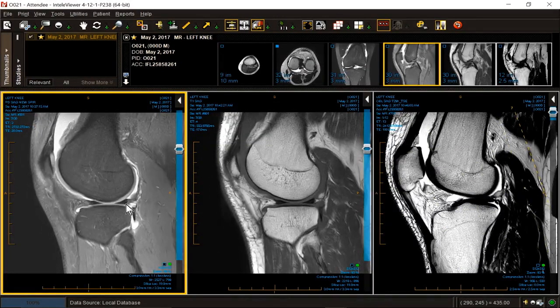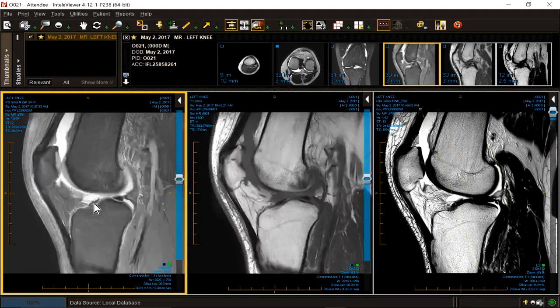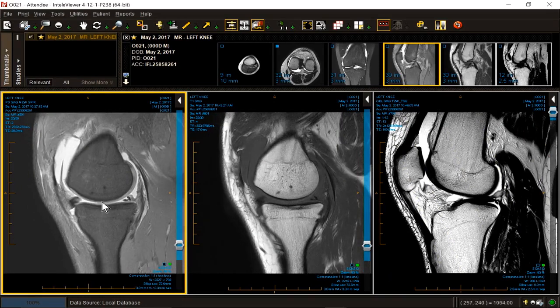The lateral meniscus triangle should be a little bigger in the back than it is in the front on the lateral side. On the medial side, the triangle should be even bigger in the back than in the front. But that is not the case. In fact, we have almost no meniscus in the back of a 23-year-old. That's not good. Where did it go?